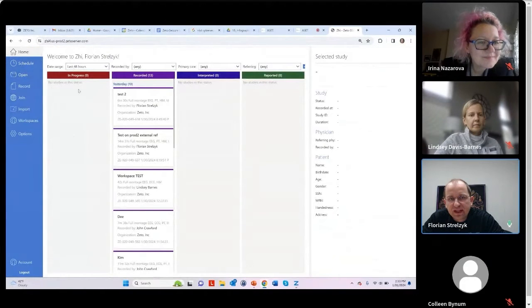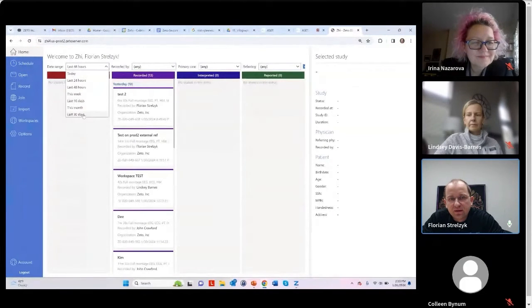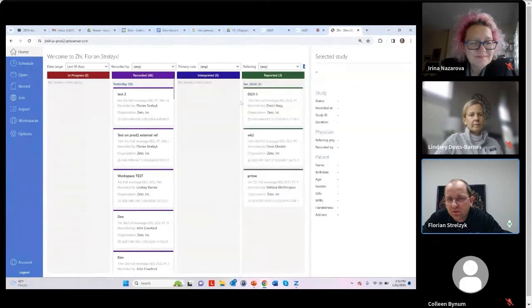This is a little bit of a dashboard that helps you see what was going on in this organization for the last 24 hours up to 30 days. This is not your database. That is more a way for you to see, okay, well, what has been happening.